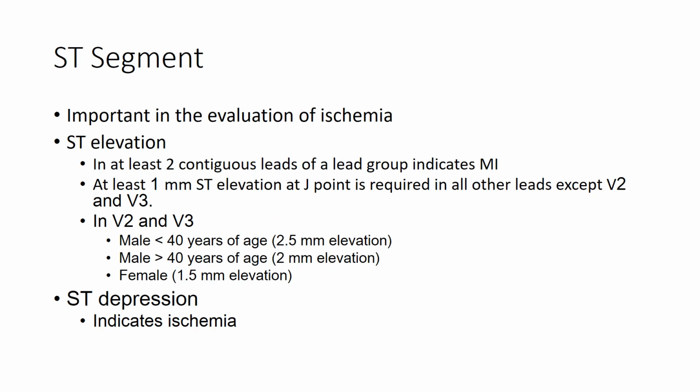The ST segment is a very important part of each cardiac cycle ECG tracing, and its importance lies in that it helps in the evaluation of ischemia. If there is ST elevation and its convexity is upward, as well as the scenario is suggestive of an acute ischemic event, then it indicates acute ST segment elevation myocardial infarction.